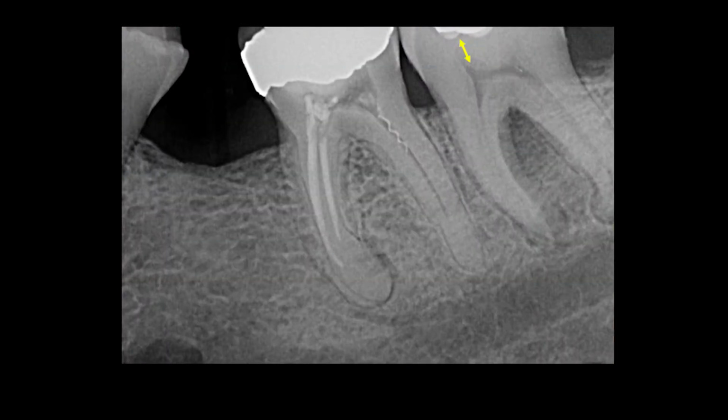Our first clue to suggesting the presence of a vertical fracture lies in the periapical radiograph. This case shows there is some distance between the previous caries, current restoration and the pulp chamber, making bacterial ingress via this route unlikely. If a vertical fracture line exists, bacteria will be able to access the pulp and root canal space via this pathway. This explains the presence of a furcation radiolucency.